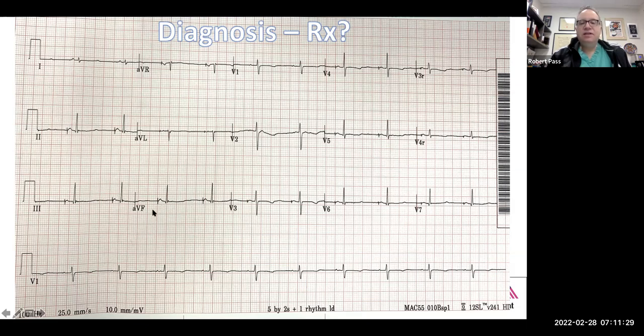So it's not always just the interval. Clearly, if the interval is long, then the diagnosis is pretty clear, but the morphology of the T wave matters also. In this case, I agree with you that the QT interval is long-ish, but it isn't super long. But the morphology of the QT segment is so abnormal in appearance that that fact, in combination with the length of the QT interval, is highly suggestive of the diagnosis of long QT syndrome. Do you have any thoughts on why this patient might be paced with this condition?